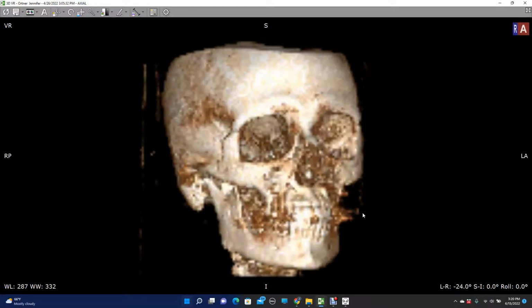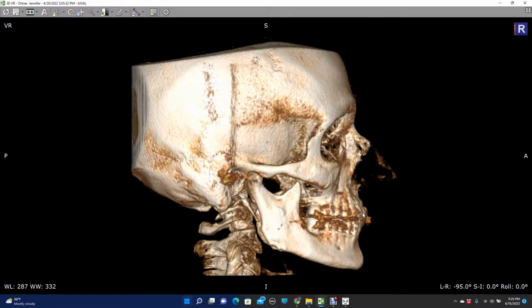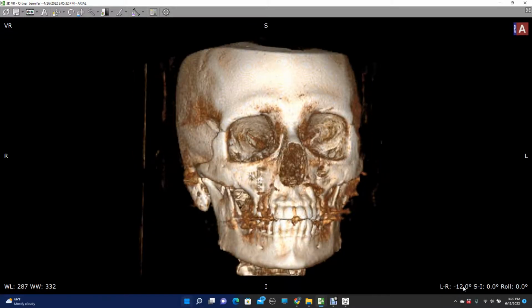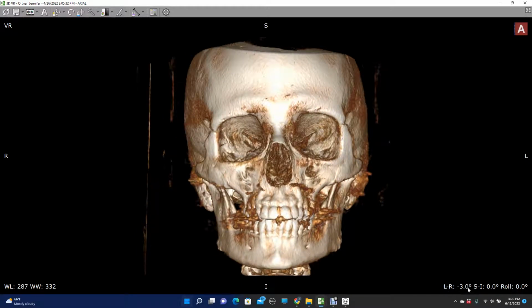The first thing I actually check is the jaw. Right? I want these jaw lines to superimpose, and so this one's not on top of that one, but they do become superimposed when we're at -3. So I assume that -3 is a good starting point, and I rotate the image so I'm at -3, which would be right there. See, that's the utility of that coordinate map.